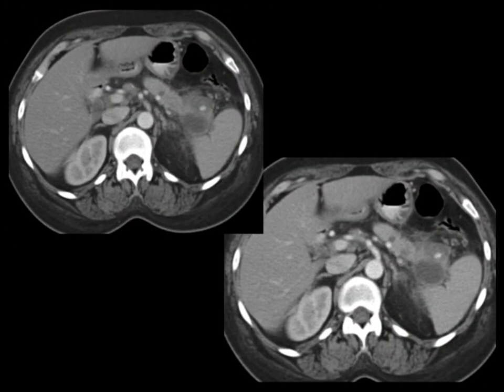Now, I mentioned pseudoaneurysms. Something usually happens. The most common thing in my experience is pancreatitis. And it's not your first episode. It's when patients have had multiple episodes of pancreatitis. The fluid from pancreatitis, the pancreatic fluid, erodes the vessel, weakens the vessel, as in this case leads to a pseudoaneurysm. These pseudoaneurysms can rupture.